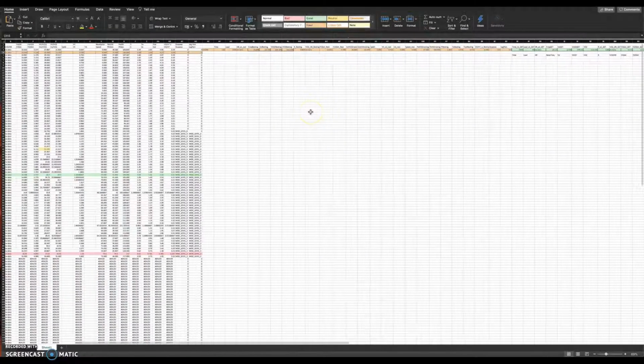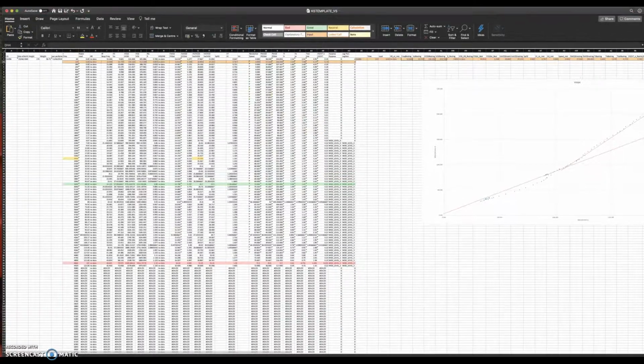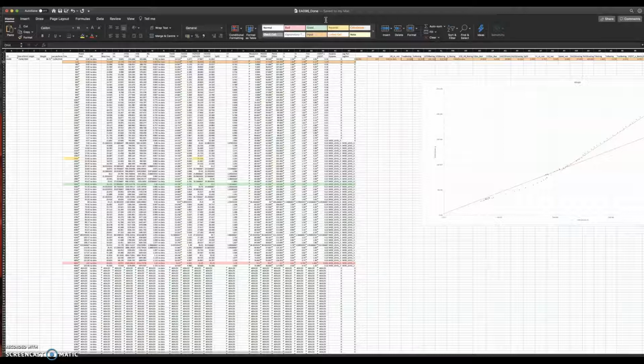Enter. And then all you do is save this, so file, save as. It's called EA096, so file save as EA096, and we can underscore it, done, press enter, and save that somewhere else, and then you can go back and use the template file again.